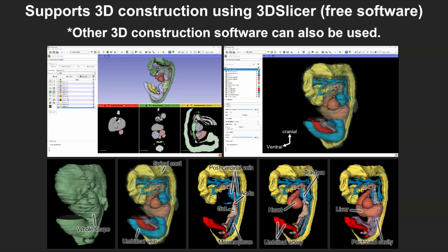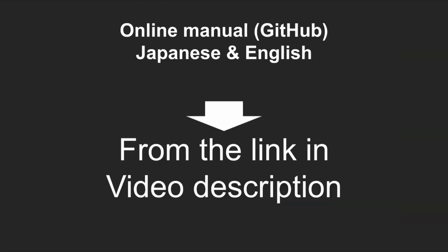By importing this data, you can immediately start building 3D models. Of course, it is also possible to use this data with other 3D modeling software, not just 3D Slicer. If you want to try using or experimenting with SegRef, we have published an online manual on GitHub. The manual is available in both Japanese and English, so please access it via the link in the video description.